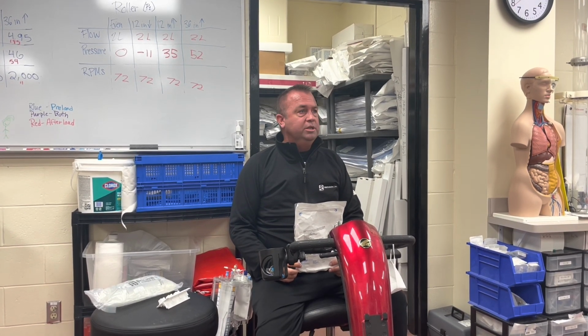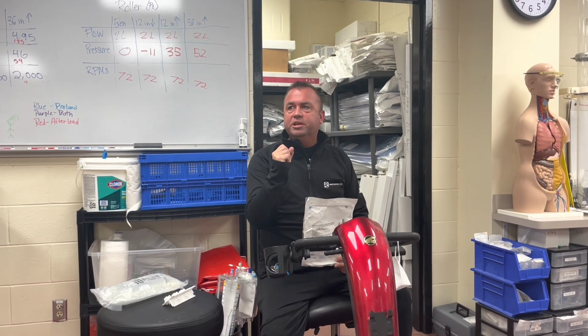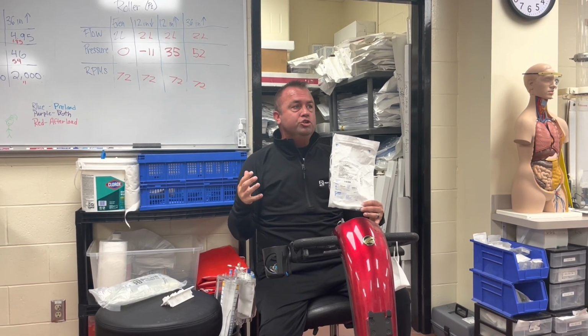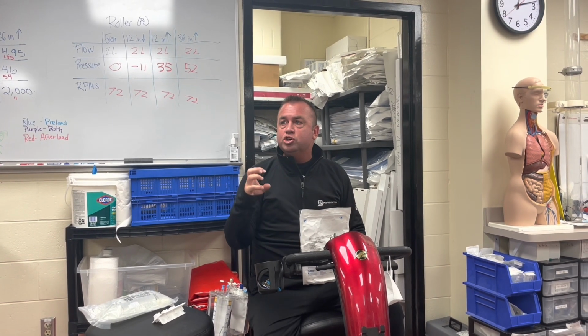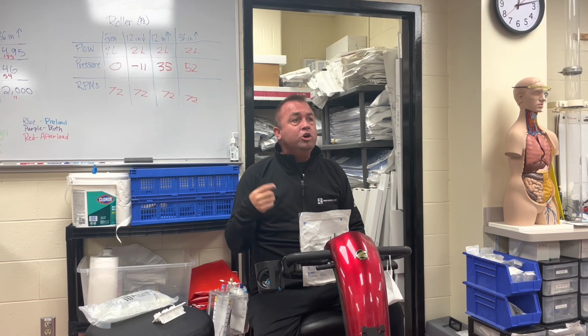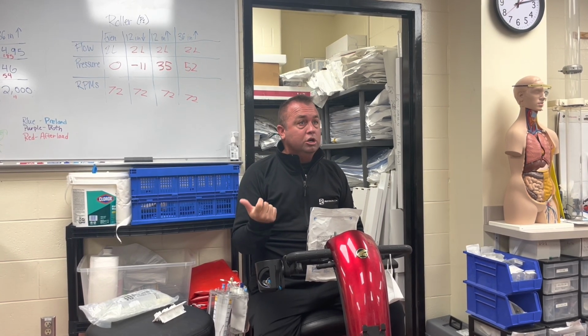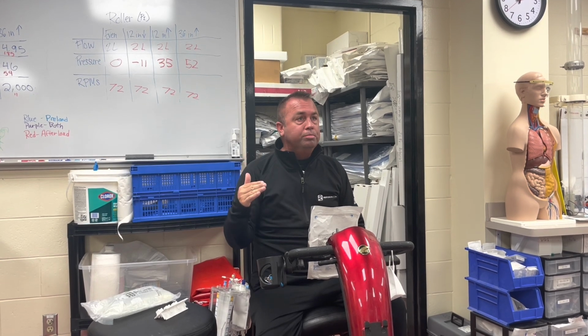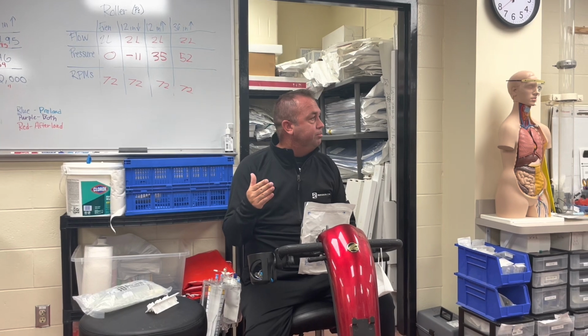Pressure tubing, what's pressure tubing like? Very thick walled and very small, right? Very small, because the larger the tubing, or the more flexible the wall is, the more that pressure will be dampened out. There are other things that dampen that waveform: air, clot, a low pressure in the pressure bag. A lot of different things can dampen that pressure.